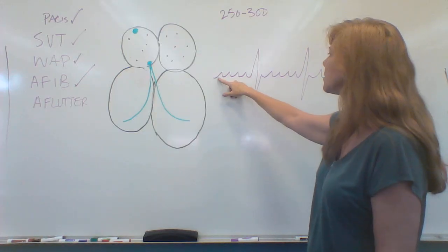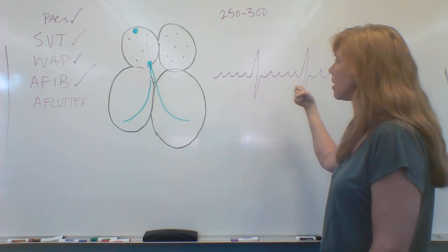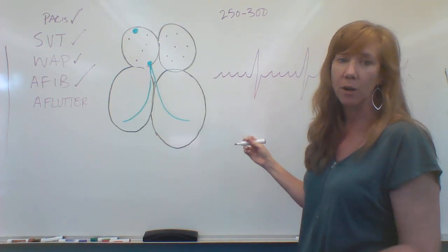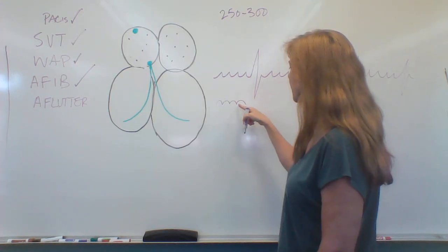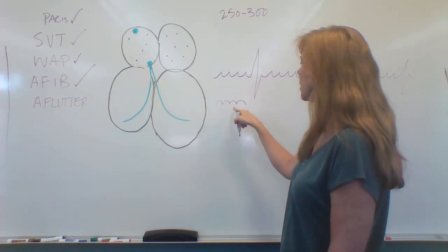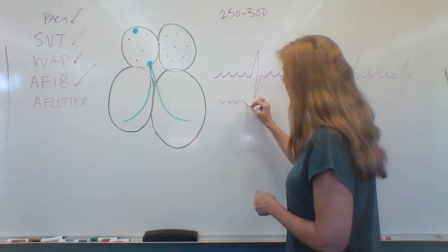But when you see these, they call it sawtooth waves, because like if it was a hand saw, and these are the sharp teeth on it. But some people's flutter waves are more round and decorative and scalloped looking. Like some people will have them like this, but to me it's like the saw teeth are just more facing down. So they can be slightly different.